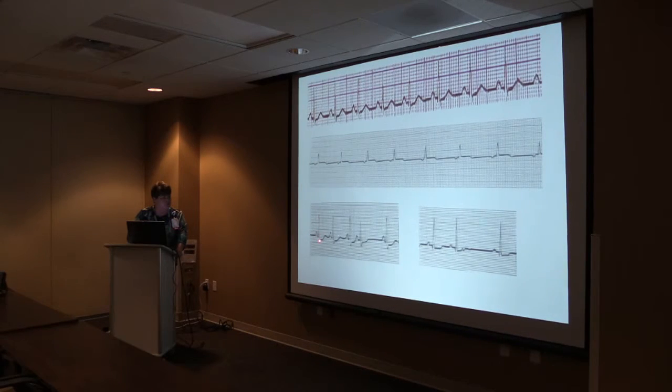Look at the patient's normal. Look at this straight line right here. So here's the patient's normal. Okay, it's going right here. So what is this? That's a P wave. Positive P wave, but it came early. So this one right here is a PAC.